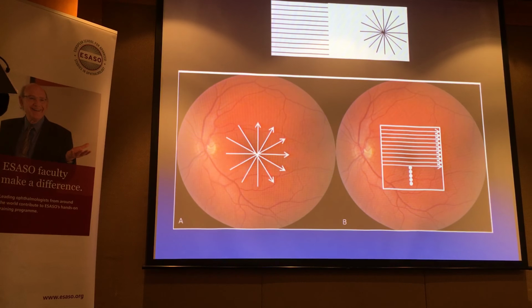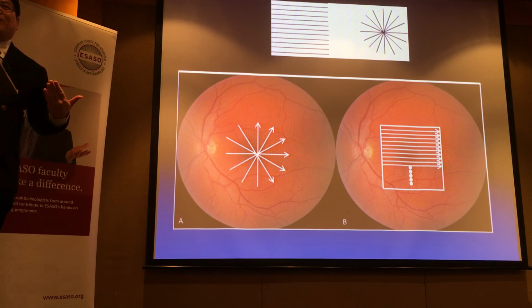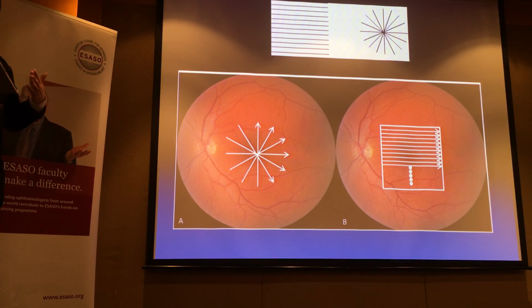But remember, something I'll mention again, the number of cuts in between the lines can vary. Most machines allow you to vary that. That's an important consideration. Okay. You can have very widely spaced scans. This one is spaced out, the drawing to illustrate the point, but you can have widely spaced scans.